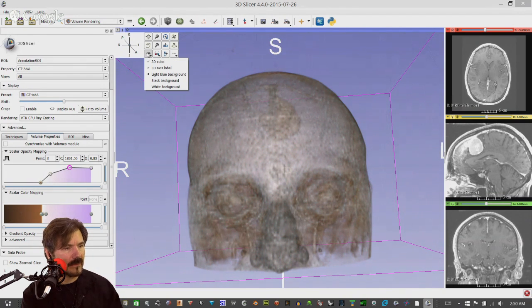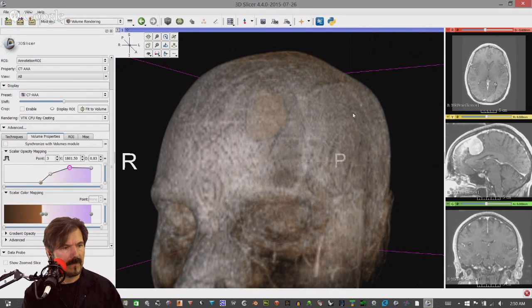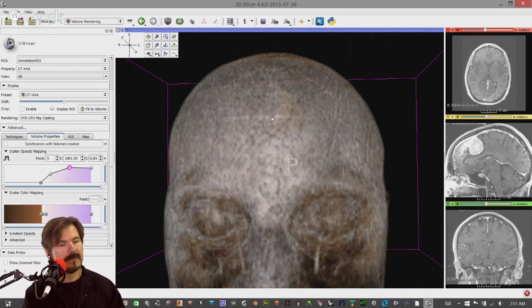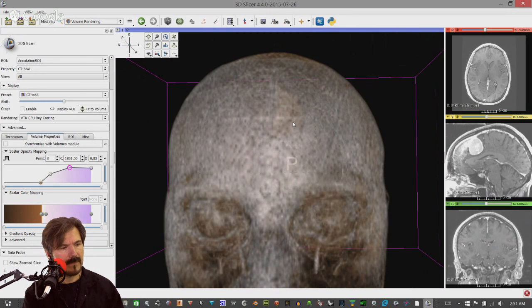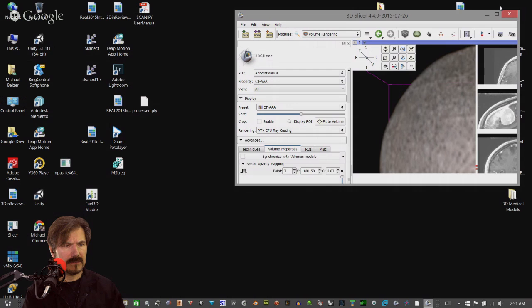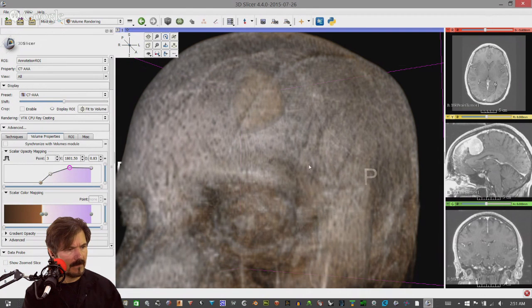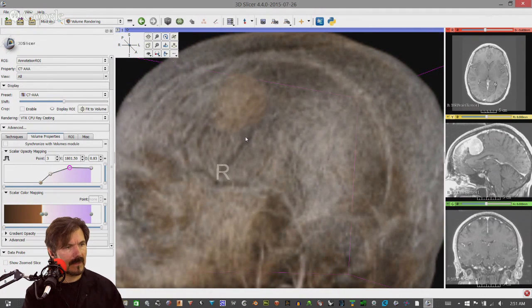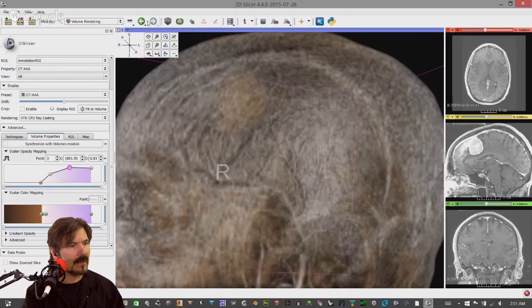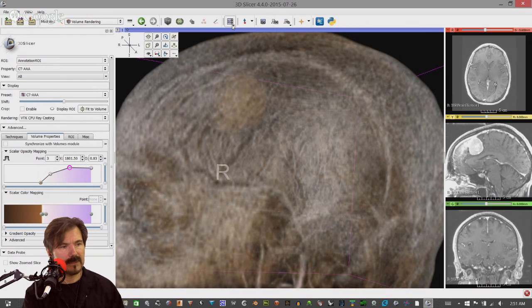Seems a little sluggish, and I don't know why. But you can identify the background color. And sometimes I like to do that. Yeah, this is really sluggish right now, and I don't know why. Yeah, mine's a little sluggish too, actually. Maybe it's the nightly builds? No, I was just using it for about an hour before this and wasn't having any issue.